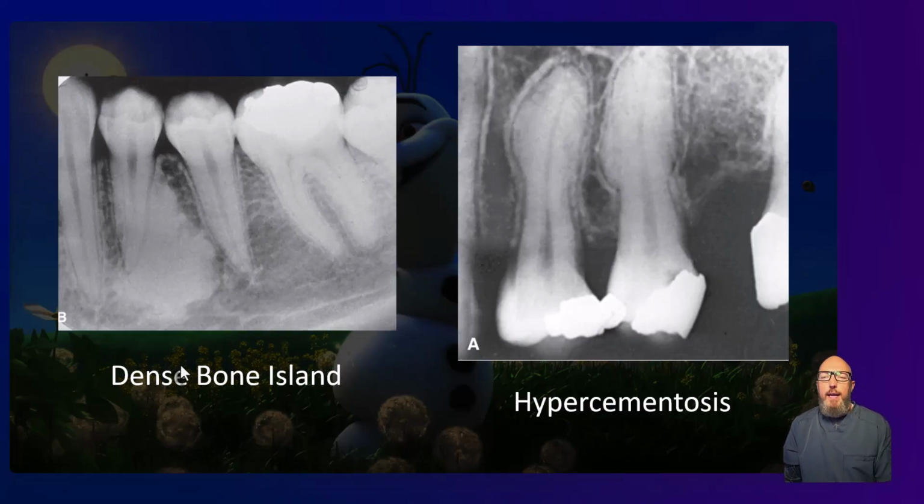All right, so that's TOFIE, the benign, dense, mostly leave them alone lesions, plus the tooth-associated dense look-alikes. Recognize them, don't overtreat them, and remember fibrous dysplasia is the one that earns real attention. Next topic, the radiopaque and mixed lesions that do have a radiolucent rim, or the CO5 differential. Sometimes I refer to these because they're opaque with a radiolucent rim as the target lesions.